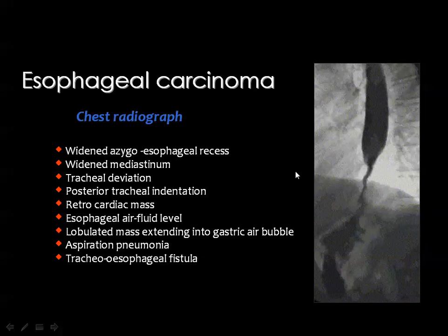Then in the era before the CT scan and the other imaging modalities, they used to use the chest radiograph for findings which can help to suspect the presence of esophageal cancer, but most of these are now unreliable.